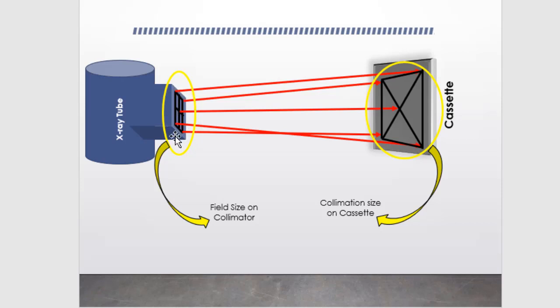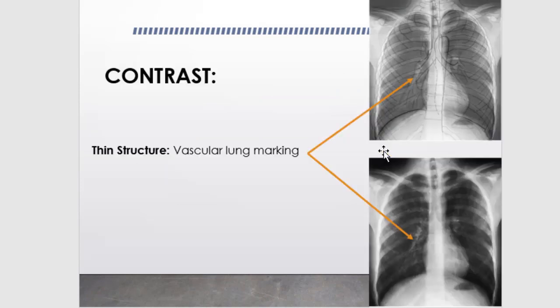This box here, of course, will be magnified because due to distance, magnification will occur. So it will look bigger here. The center here is actually the center here. So if you have 4-side collimation, only then can you detect the centering point using the X technique, connecting the borders.